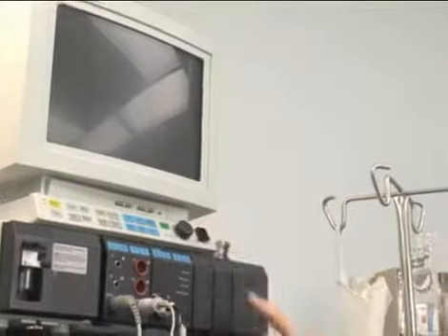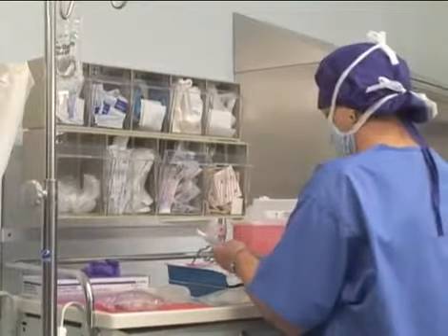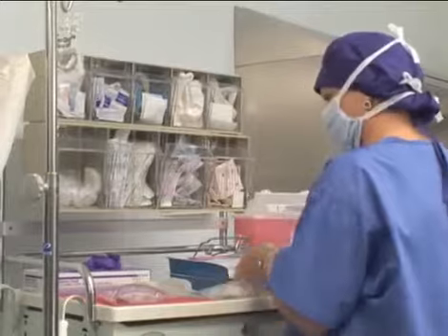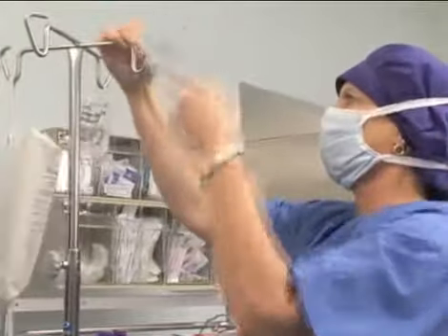The anesthesia care provider assembles monitoring equipment and other accessories, such as cardiac leads, airway equipment, compression devices, and warming and cooling blankets. If power equipment is to be used during surgery, the inline or tank gas sources must be tested and gauges set to the manufacturer's recommendations.